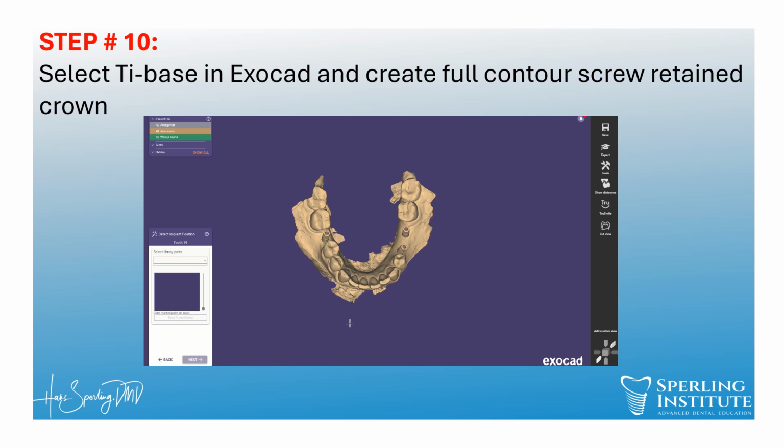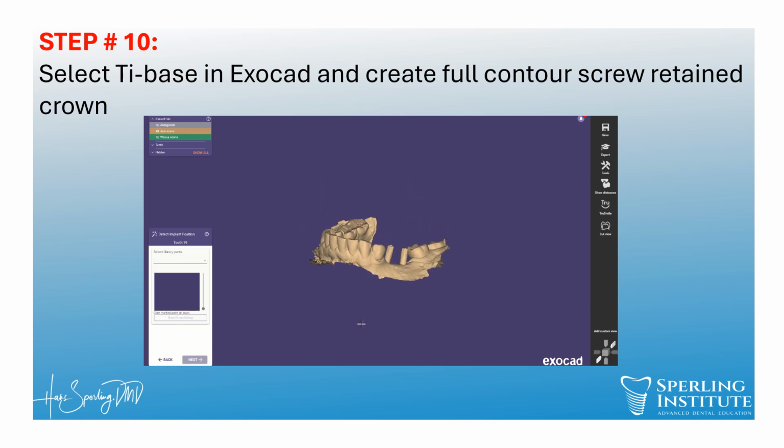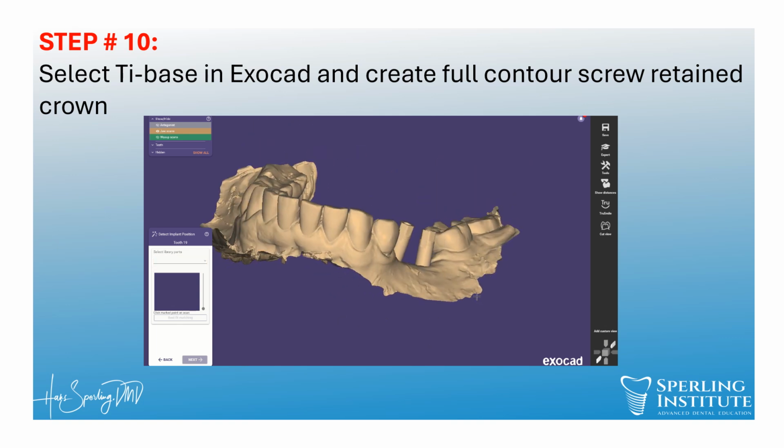And now we go to the library. So for tooth number 19, we have our scan body. So we're going to select the Norris library from our library of parts. Again, this is for the Implant Direct Legacy series, which is an internal hex. It's compatible with the Zimmer TSV. So it's the Norris internal hex.